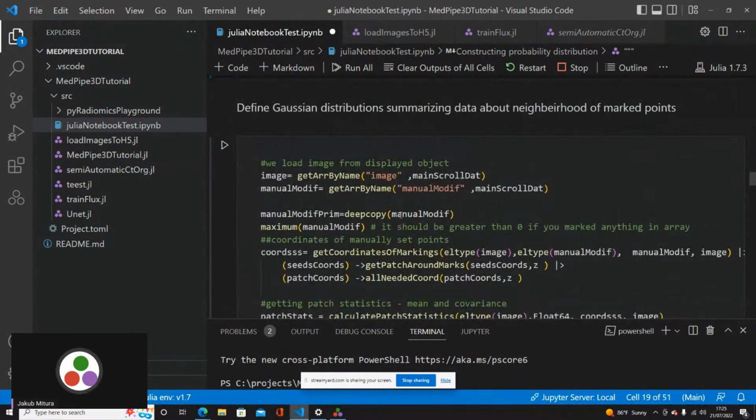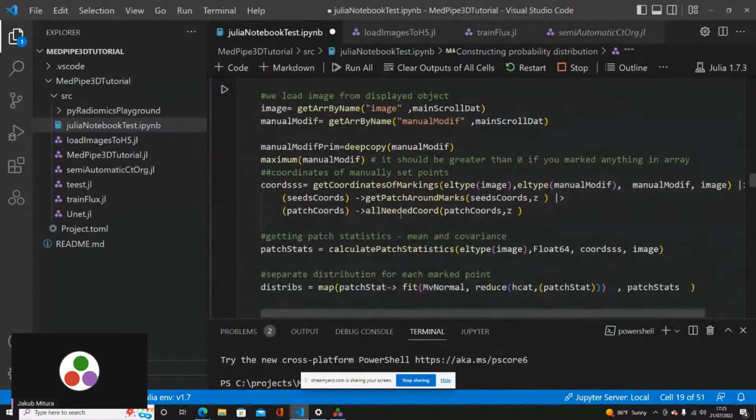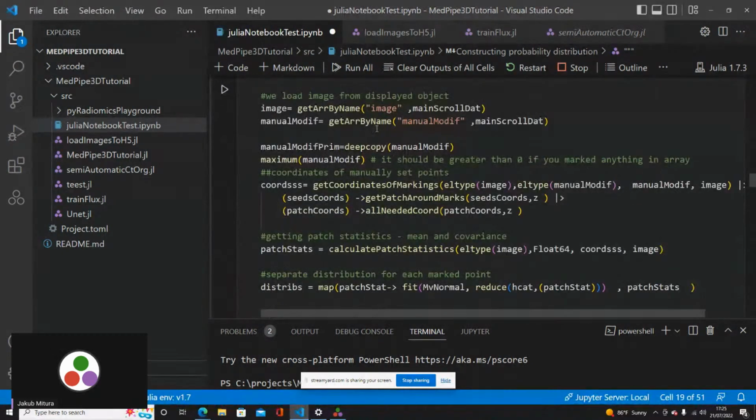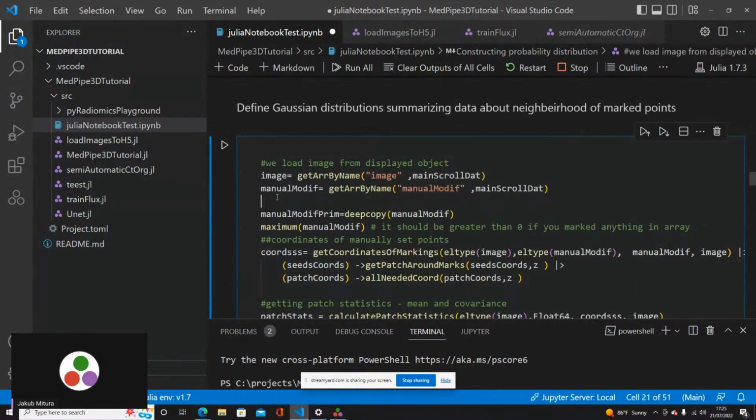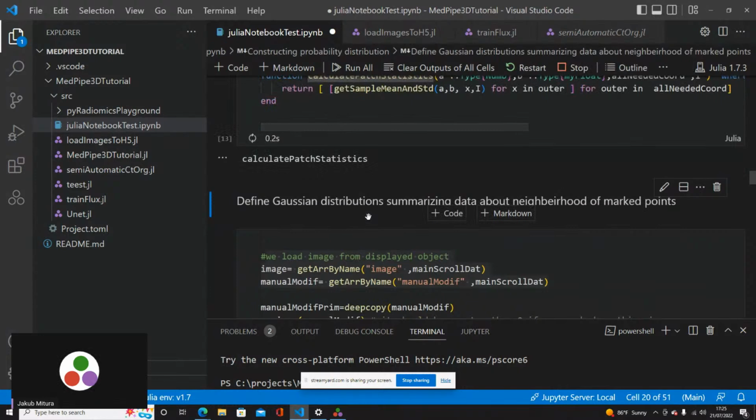As I said, this is just an example to get, from the very basics, an algorithm that works without any magic, and without any deep learning for now, at least. So we already have some functions that can define it. In order to do this, we need to get access to the arrays that we have. Oh, I did not execute this.